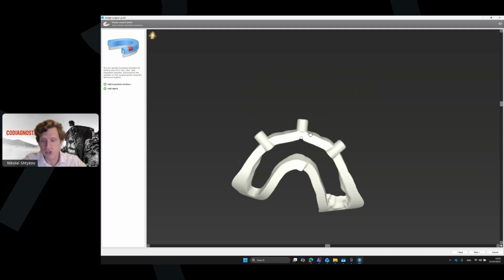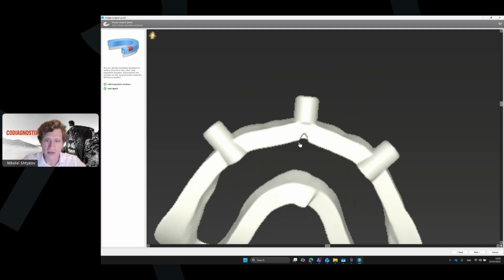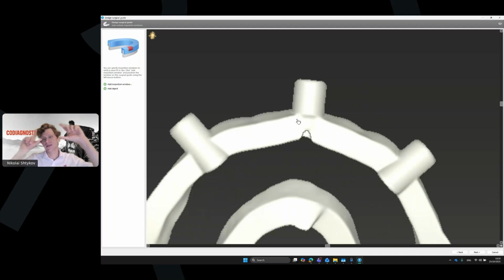And now here is the result. And that was the reason why I extended these sleeves. You see that this cylinder is just for a sleeve, and if we do not extend this, it will connect here. The pin will be inside, but because this is a hole inside, I prefer to have a little bit more plastic here.